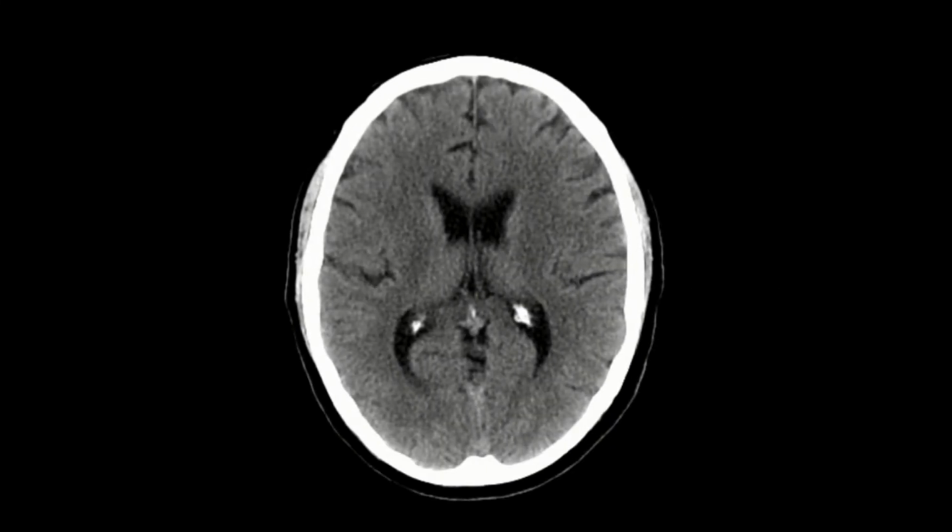Right, so this is part 2 of CT anatomy. Disclaimer, it's quite long, so hold your horses. Alright, so let's talk CSF spaces.